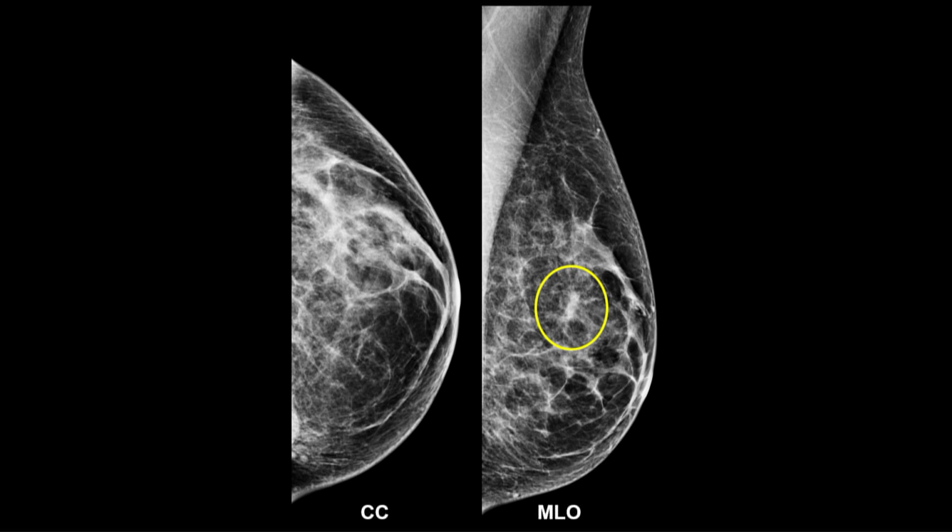What you don't want to do is ultrasound. Ultrasound is not part of the workup of a one-view asymmetry because ultrasound cannot answer that question. Ultrasound can answer other questions, but not the question of a summation artifact. And the reasoning is very simple.